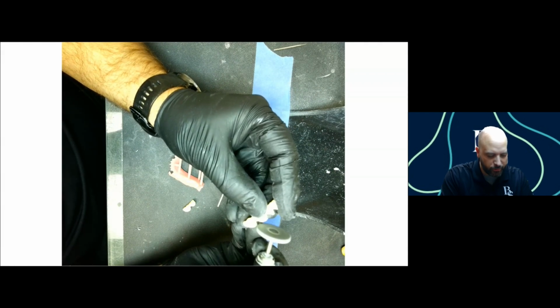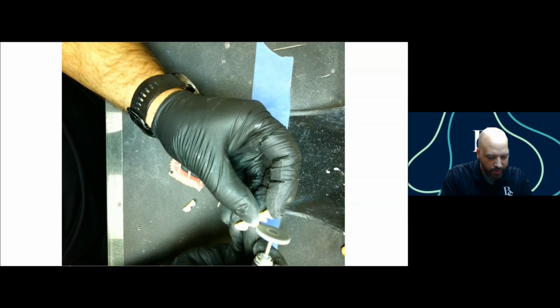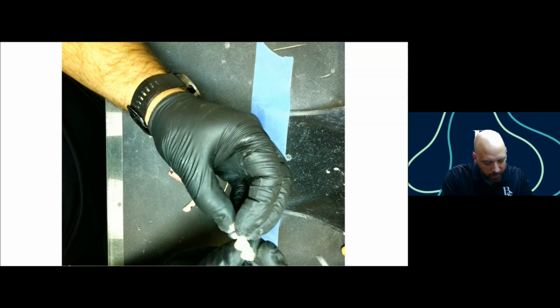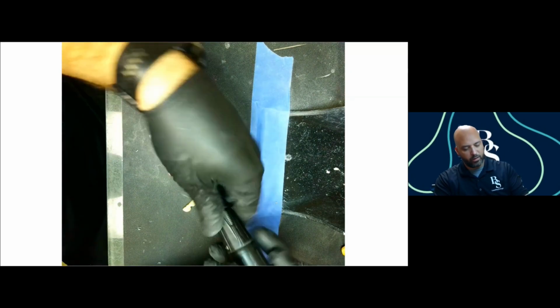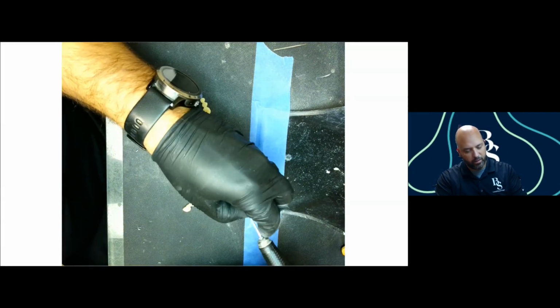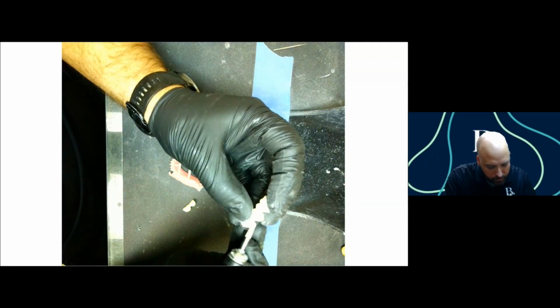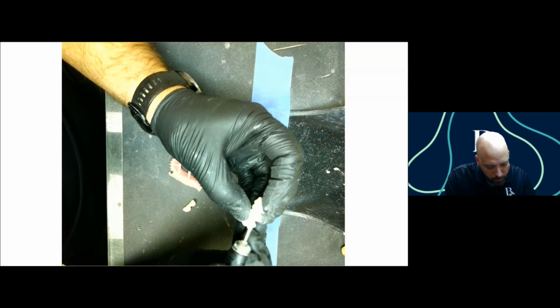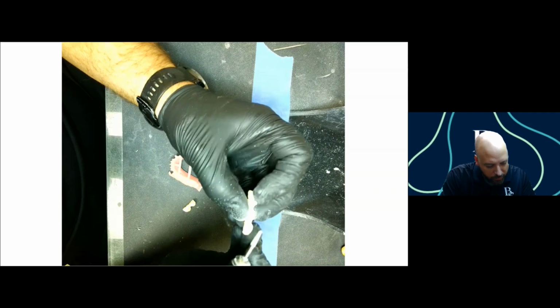And so all I'm doing is rotating it and looking from different angles so that I can try to track down any of the little support nubs that are still left on here. So I got a few in the interproximal area, so I'm going to switch to my carbide and go in there. You don't need to be real aggressive with this because this material before it's cured is nice and soft. So these things will come off real easily.